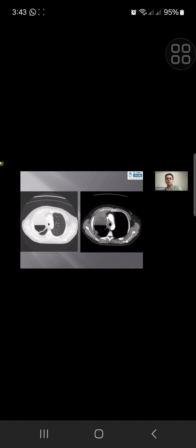So that's actually a bronchogenic cancer. And you can see quite thick soft tissue there. Can you see that? Yes. Quite thick soft tissue, on the background of which it has probably got quite a lot of necrosis, giving the fluid, and it may have developed a fistula to one of the small bronchus or something, which may explain the air in it. So this will be taken before the biopsy, I think. Yeah.